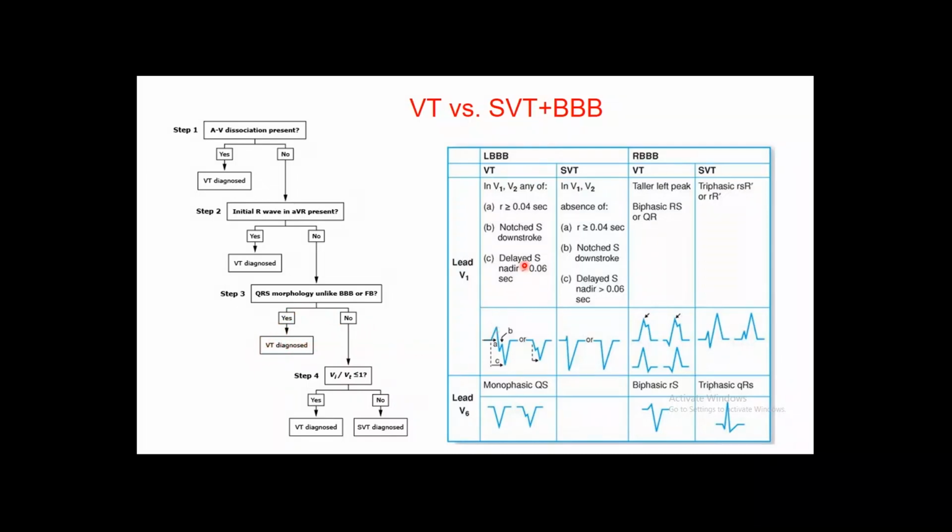Then we have other multiple points, but for the sake of time and being at the beginning of ECG reading, consider any wide complex tachycardia, especially in an old male or ischemic patient, VT until proved otherwise.